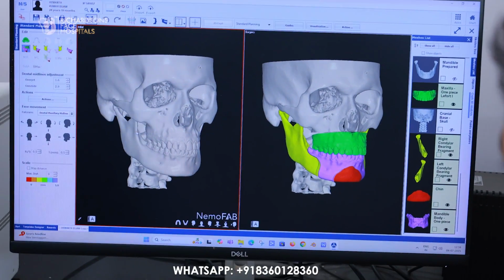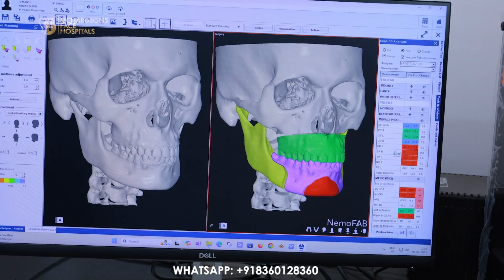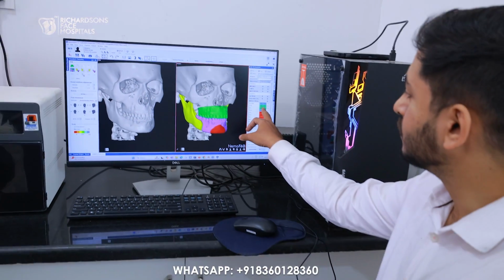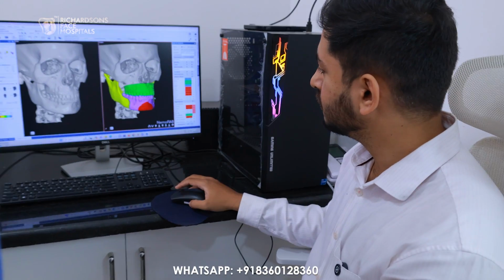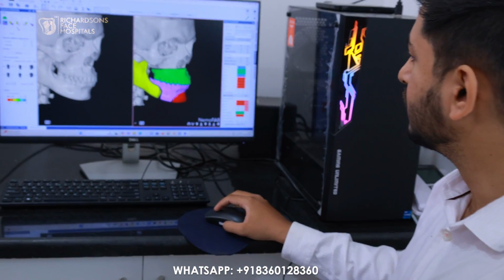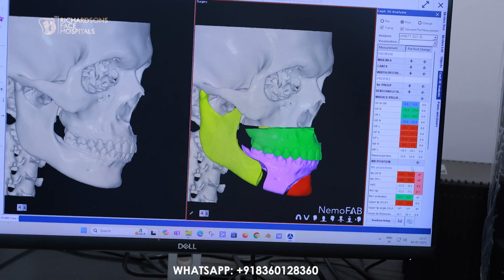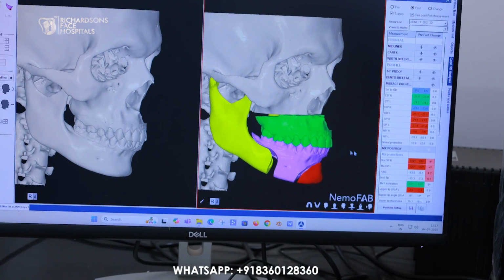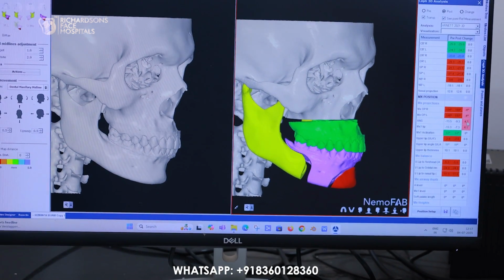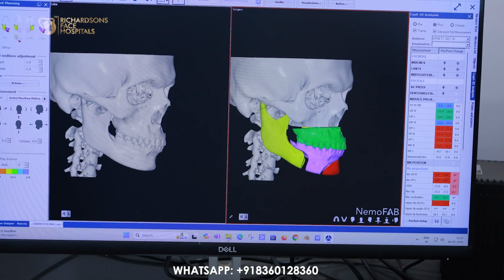All right, then also show the software listing that you get before you plan it, the figures. Yes, sir. What we have here is called 3D cephalometrics. It's not only the linear movements, we have the angular movements as well. Whatever degree we have given, the pre values, the post values, and what we have changed, it's all marked in the 3D cephalometrics. If I press the button here, it shows me the values. Just a second. I think I have to go back to this.